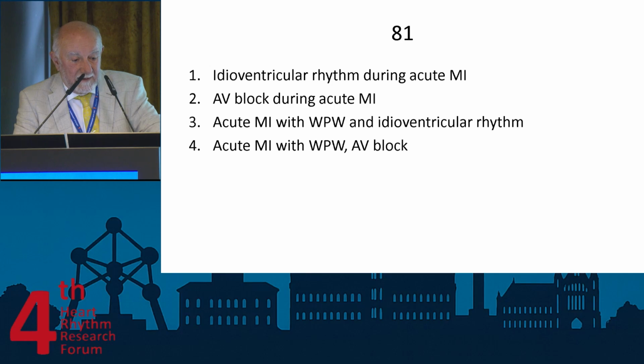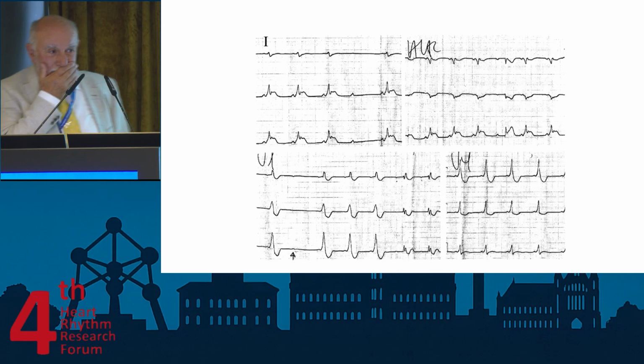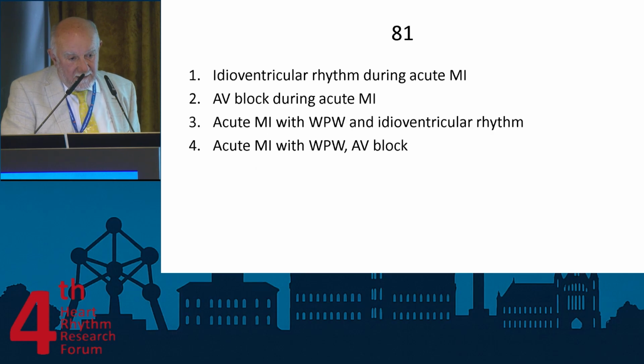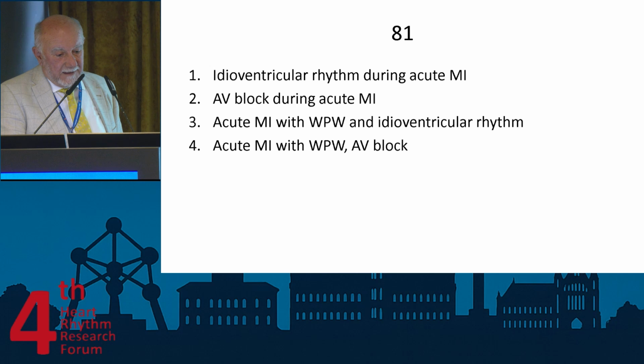Let's go back. V4 is... There's a short PR. Can you show us the other? I would say all 3 or 4. Shall I go back up?